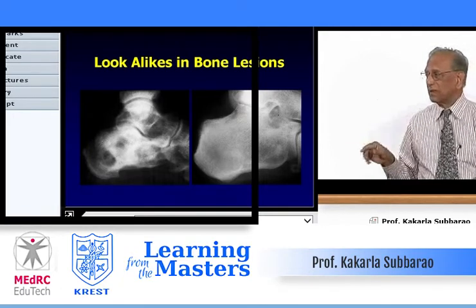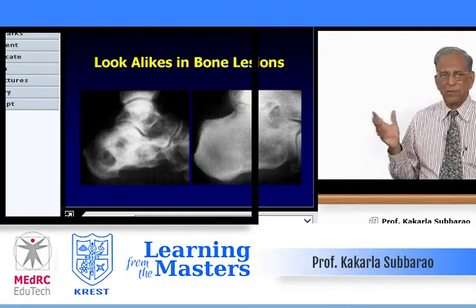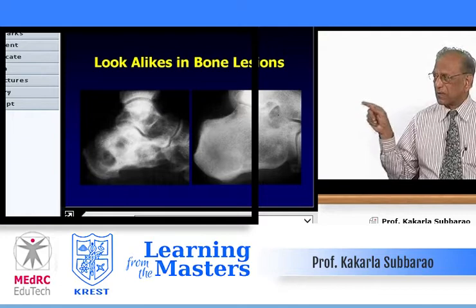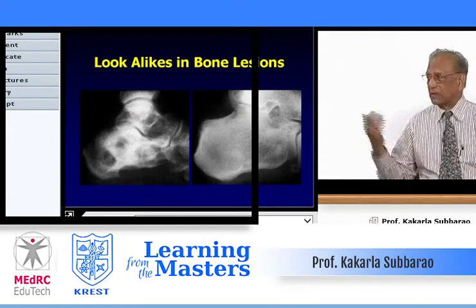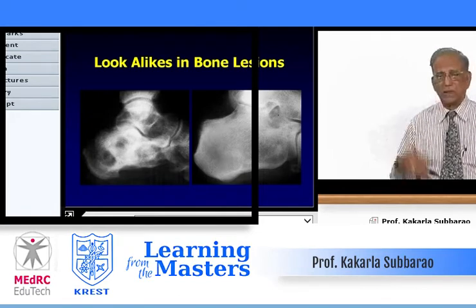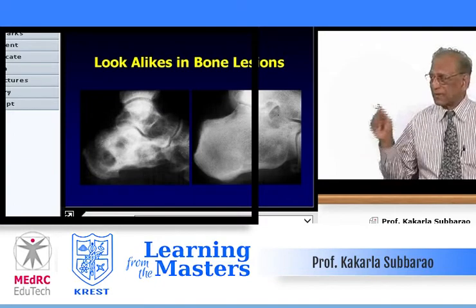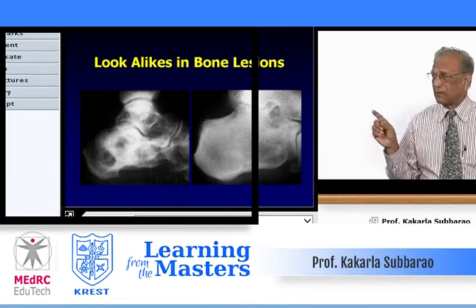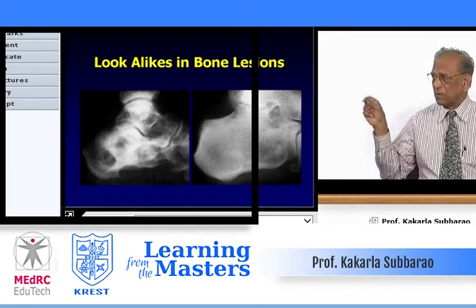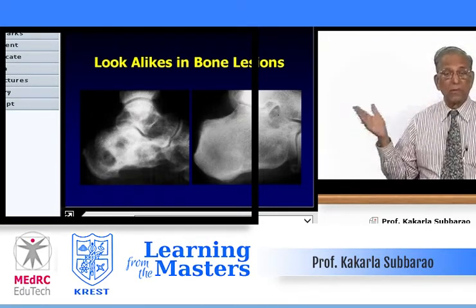One on your right side, again, you see a lucent lesion, no definitive margins, and there are calcific or ossific densities anteriorly. You see multiple, as though they are bone islands. What could this be? It is an adult and a lytic lesion in the calcaneum. Some calcific densities prove to be chondrosarcoma. These are not classical in the sense they are not the popcorn type of calcification or arc-like or ring. They are just oblong, as though they are residual bone islands. Why should islands be there? Residual bone trabeculae you should see.